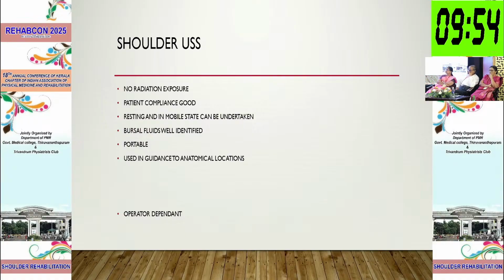Now, the importance is that in multiplanar imaging of the axial, coronal and sagittal, you can see the bony structures better and the displaced bony fragments, which we give in a volume render technique and demonstrate for the orthopedicians. Now, that's the plain X-rays, and I would say the plain X-rays are still the most important. I've gone very fast, I know that, but they are still very important for us.